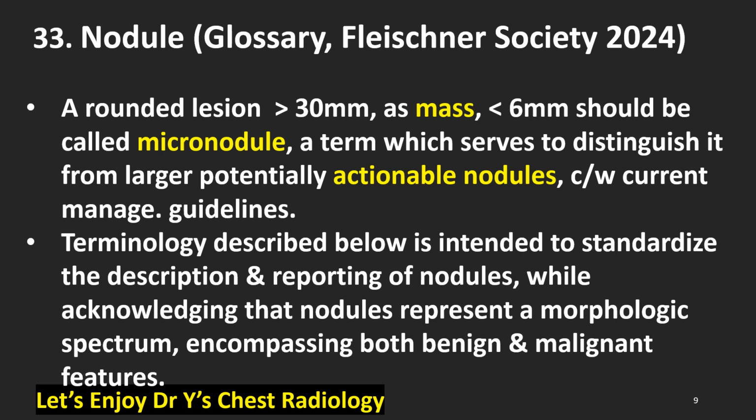Terminology described below is intended to standardize the description and reporting of nodules, while acknowledging that nodules represent a morphologic spectrum encompassing both benign and malignant features.